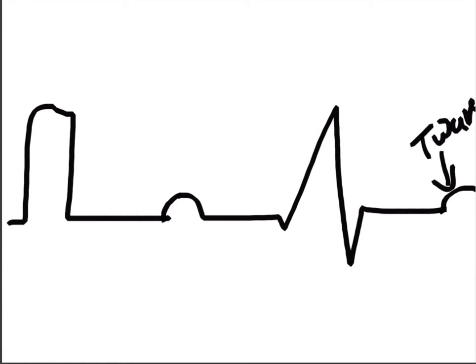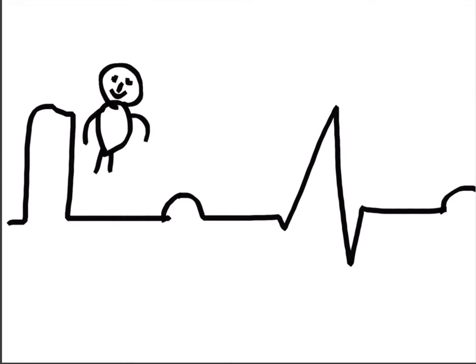So you can see our series on ECG basics to know more about these, and there are more detailed videos about the ECG. In this video we will be focusing on this STEMI. So let's see what this guy does to change this normal ECG in the STEMI.